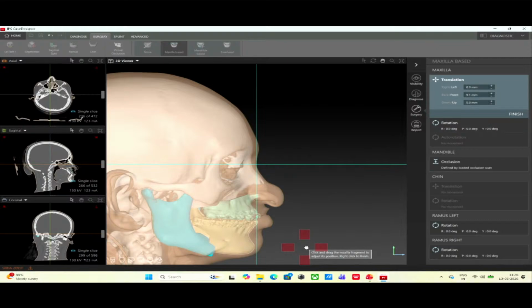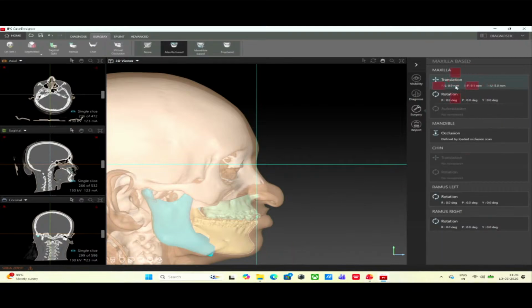Again, this is a reference line which I use. There are multiple more soft tissue lines which you can use as a preference. And at the end of the day, you also need to discuss with the patient what is considered aesthetically nice. But that's how I orient myself, how much forward movement I give to the patient. If you're done with the translation movements, I usually go to the rotation movements then.